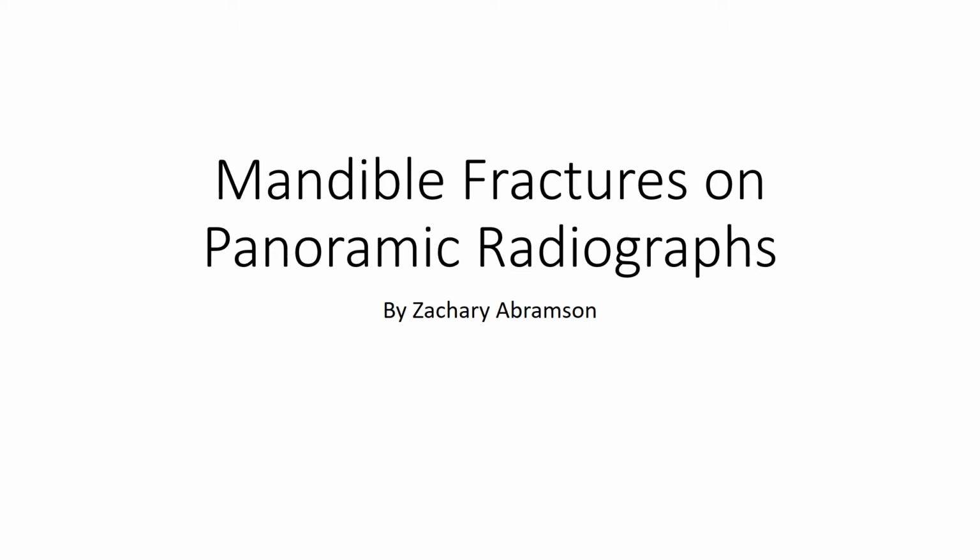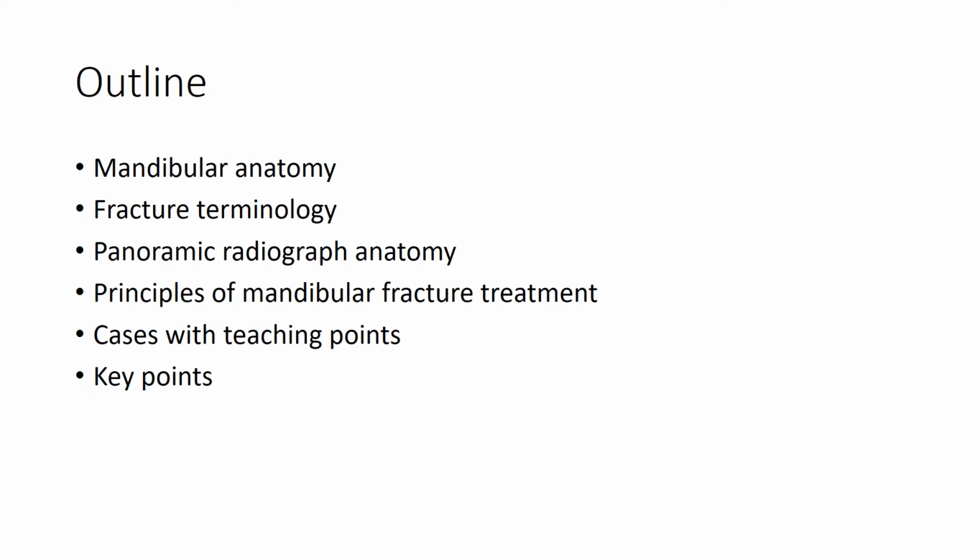Furthermore, even in cases where a facial CT scan is ordered and allows for the diagnosis of a mandibular fracture, the post-operative radiograph is typically a panoramic radiograph. So, learning the appearance of mandibular fractures on this imaging modality is important. This is not going to be a comprehensive review of mandibular trauma, and I'm not going to be discussing the appearance of mandibular fractures on CT.